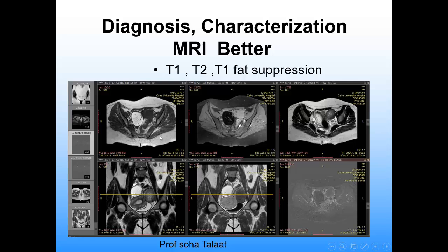Regarding the other lesion, the left one is hypo-intense on T1, relatively hypo-intense on T2, not suppressed, meaning it is not hypo-intense originally. And here on the post-contrast, it takes very faint contrast enhancement. Low T2 signal means benign lesions, fibrous-containing tumors like ovarian fibroma, fibrothecoma, all the fibrous ovarian tumors will be like this. So here, you know what is meant by MRI characterization of lesions. Okay?